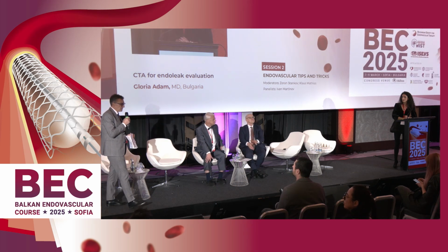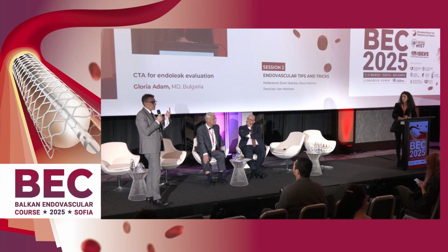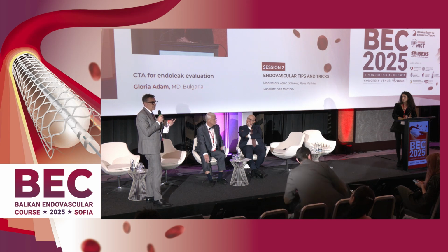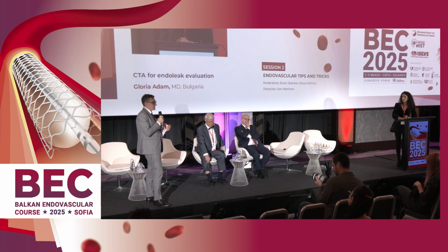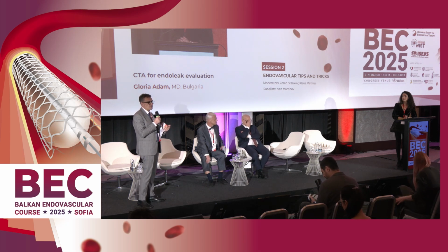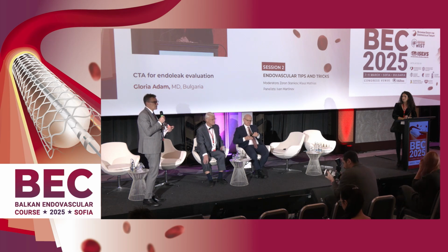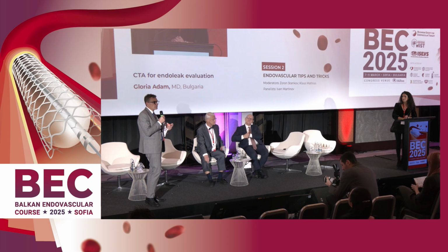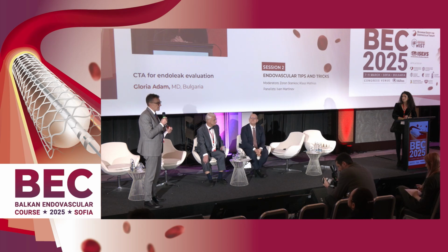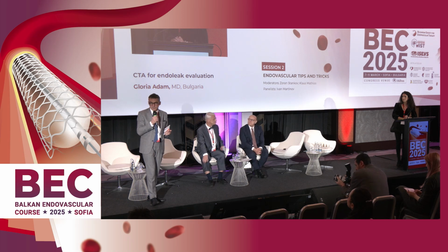And in fact, during the surveillance, that has to be at least once per year, we are taking care about late complications, late endoleaks, because in case it's described and recognized early, it's relatively easy to be treated. In case it's recognized in the late phase, it's possible even not to be recognized. So the patient can have a rupture of the aneurysm before being treated.